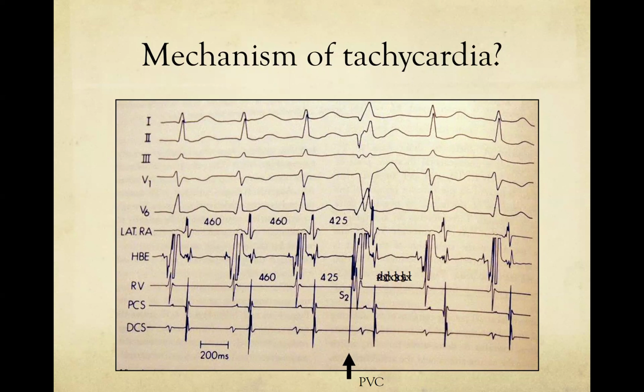Going up the accessory pathway is what is. Yes, right. So accessory pathways in PJRT tend to conduct very slowly. What's interesting here is that although there is some interval between the V and the A, it's not very long. But what is long is the A to H interval, right?